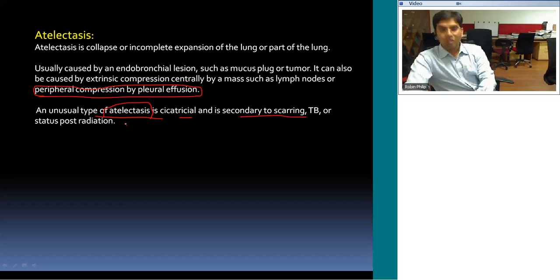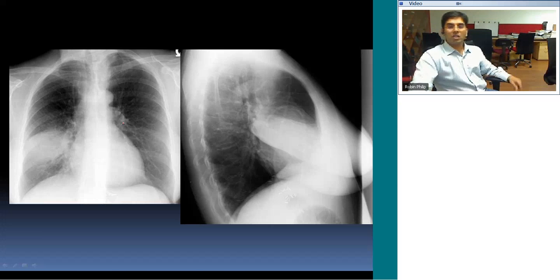See this chronic atelectasis, and this is how it looks. See this, fairly well defined, no air bronchogram. And then you can see only part of the right middle lobe is affected here. Sorry, only part of the right heart border is silhouetted. And on lateral, if you see that, this is located in the right middle lobe. The opacity is overlying the right middle lobe, right?